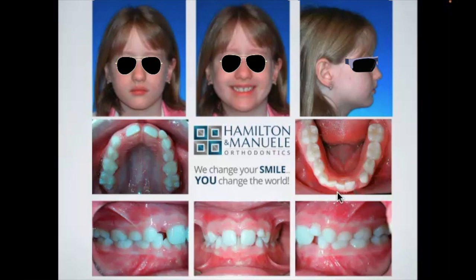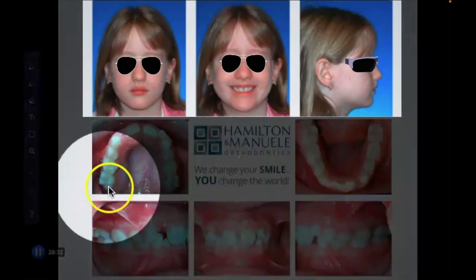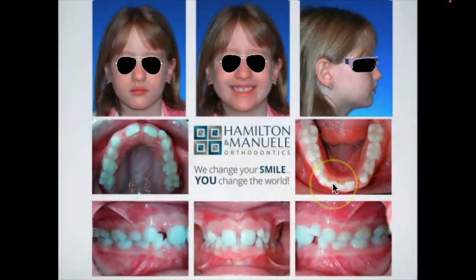So we're going to want to look at the pano and see, is there some sort of impaction happening? Is that starting to form? Is there root resorption happening, or is that likely? And are we going to need permanent teeth extracted later if we don't intervene? Now, are we going to need permanent teeth extracted? Probably not with 2 or 3 millimeters of crowding, right? On the lower, harder to say, okay? And if these teeth don't have enough room to come in, the most likely thing is impaction. Second most likely thing would be ectopic eruption, right? The canine erupts somewhere other than the middle of the bone where it should.